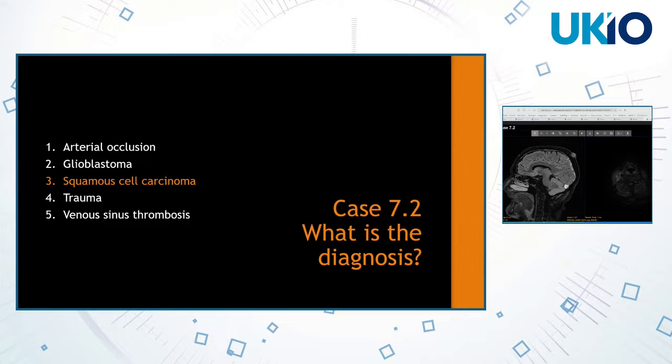Extensive cervical lymphadenopathy led to compression of the jugular vein, and then this chronic venous sinus thrombosis. The patient had very little in terms of neurological sequelae from this, but it was pretty unusual. So I thought this was an interesting case just for remembering that sometimes you can find the ultimate answer on your film, but you have to look at the edges, and it's easy to miss.